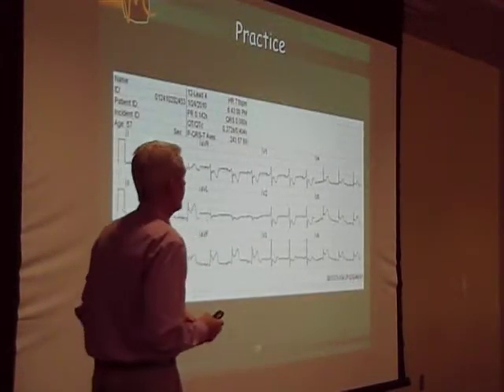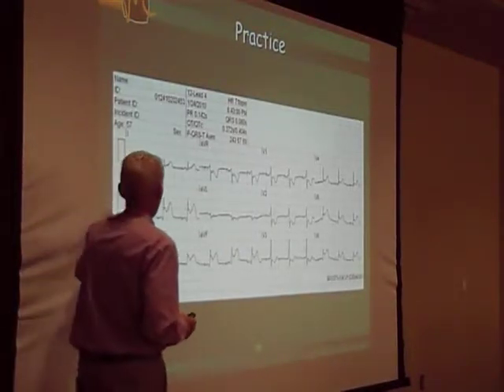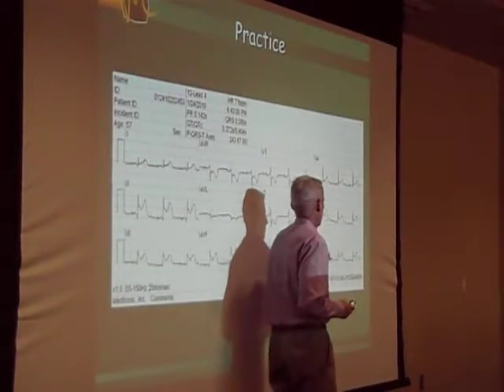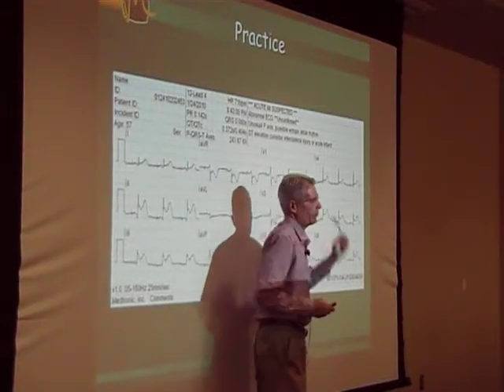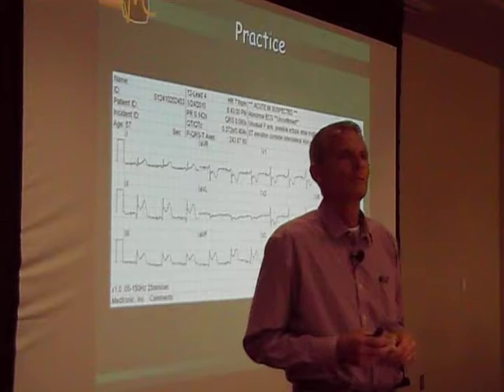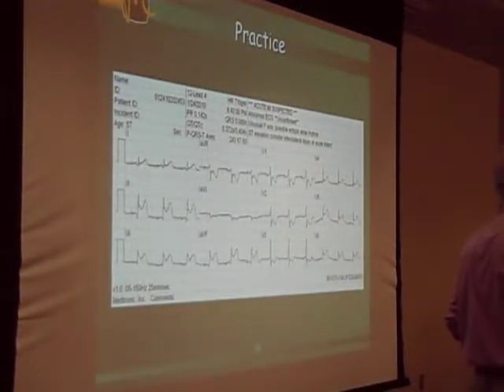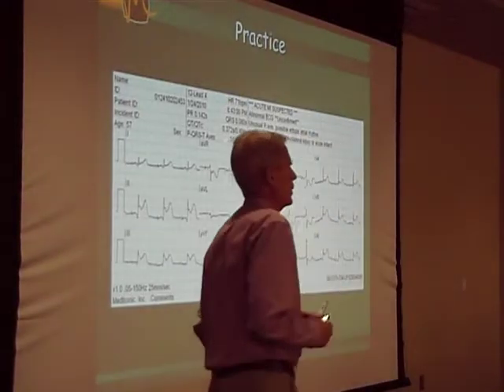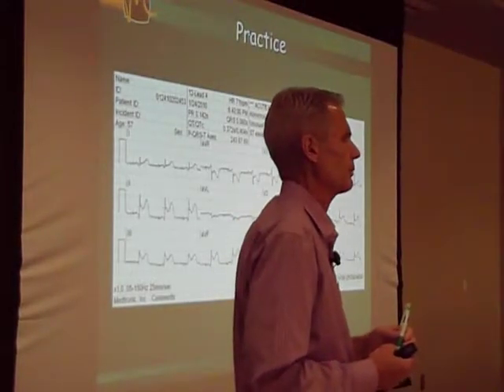Good. I heard inferolateral injury. Inferior grouping, plus you have it in your lateral views. Up top it says inferolateral injury. Who can tell me what rhythm that is? It's a paced rhythm, isn't it? But this isn't a normal paced rhythm that you're used to seeing, is it?